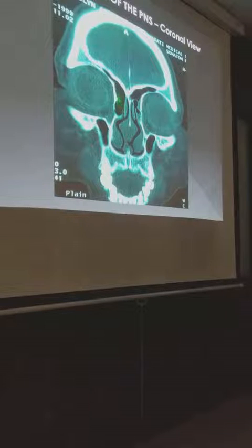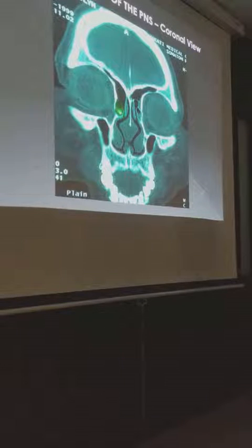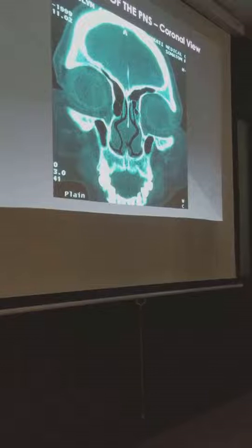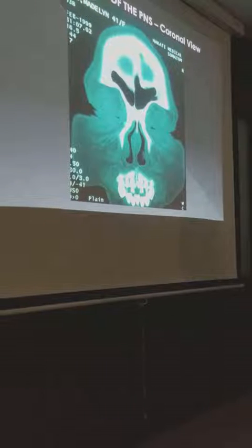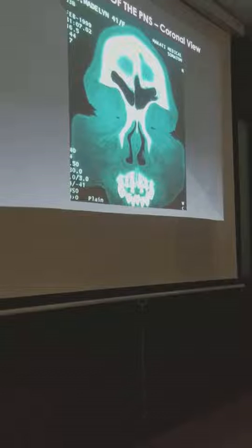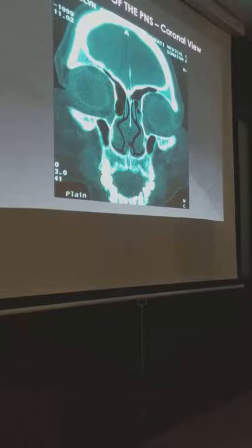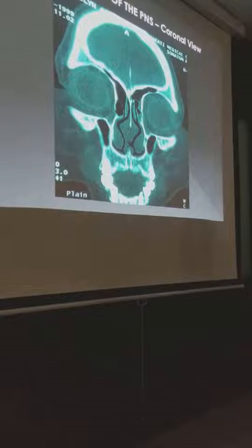So if you look at it this way, if this is the agger nasi cell, what are its relations? You know that anterior to the agger nasi cell is a thick bone, which was backwards. Which is that? Diba? Bago lumabas yung cell, diba ito muna nakita nyo? So what is that? That's the frontal process of your maxillary bone. Now go back. So that's the anterior relation. As you go, diba? That's why when you see it in succession.